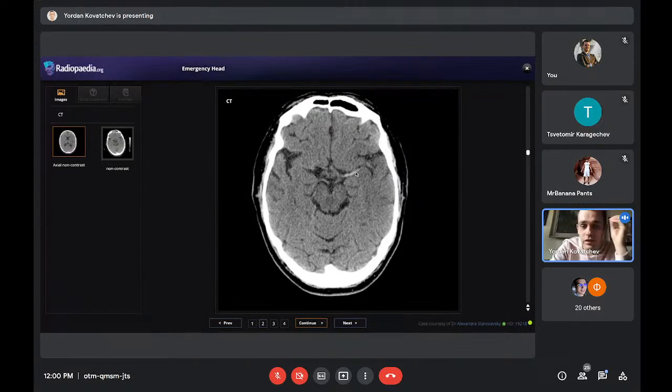We see the thrombus inside the artery. And it's pretty common. We don't see it every day, but it's pretty common. But you have to spot it, because when you spot it and you do a bunch of other things that there is no time now to explain, the patient can go not only into intravenous thrombolysis, but they can also go to the interventional radiology department and have their thrombus extracted. We can have a mechanical thrombectomy and significantly improve the outcome of the patient.